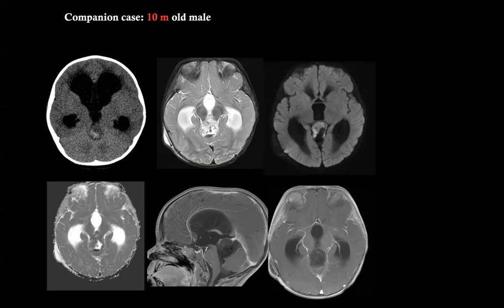There is hydrocephalus. Well, the location is slightly different. So this is more supravermian, but actually you can have this entity also centered on the pineal gland. Another very important difference is the lack of enhancement and the striking diffusion restriction. All the rest doesn't really matter much.